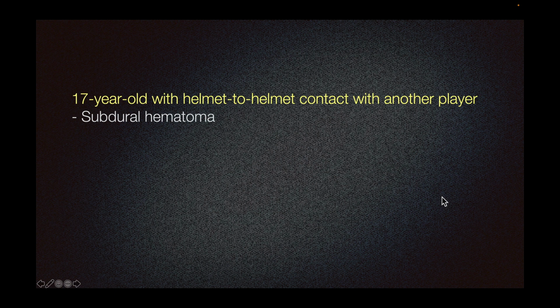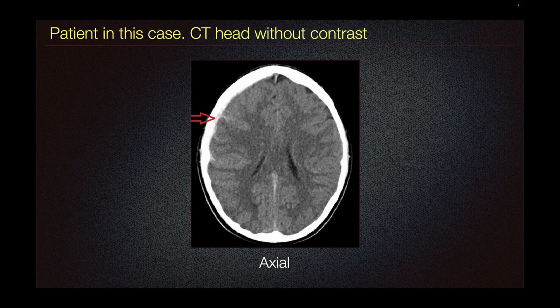17-year-old with helmet-to-helmet contact with another player, concern for subdural hematoma. In the setting of trauma with concern for subdural hematoma, CT without contrast is the imaging modality of choice. The patient in this case presented with this CT head without contrast.